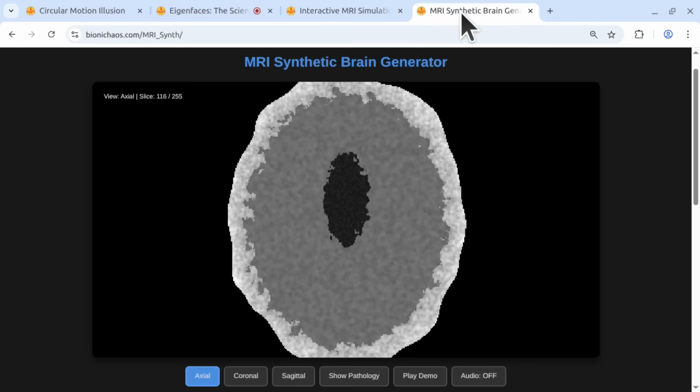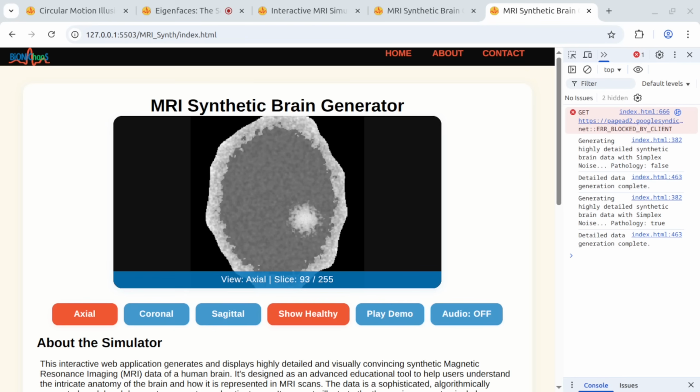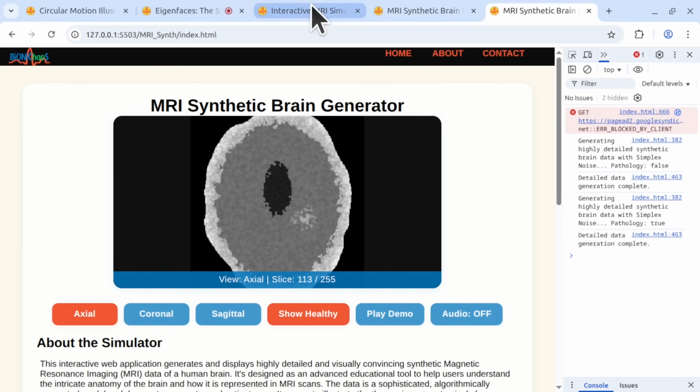We're actually trying to fix another simulation that we have a bit better. I don't know why it takes so long to load the data. Okay, just a conversational response without modifying the code. Can you explain why the web application is a bit too heavy on the browser?